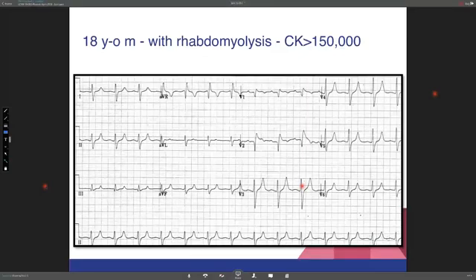Okay, so B is what? B is Brugada, so we have 1 Brugada, 2 Brugada, and A hyperkalemia, and then another Brugada. So we have 2 B for Brugada and 1 A for hyperkalemia. Maybe give it 15 more seconds, see if there are any more comments. Brugada pattern, yes, I like the word Brugada pattern.